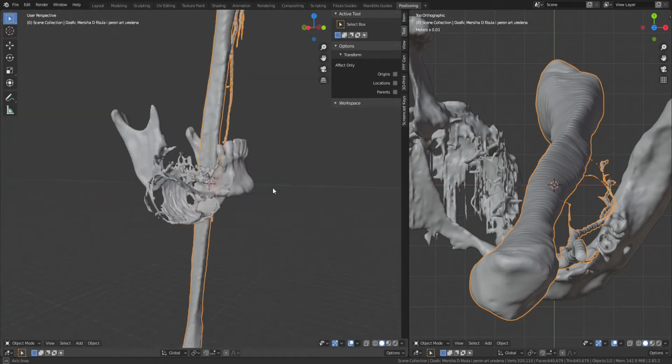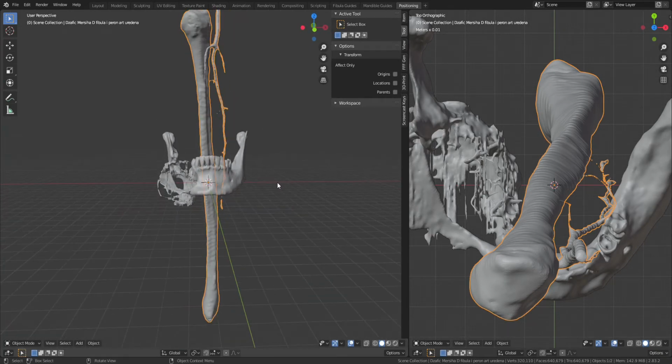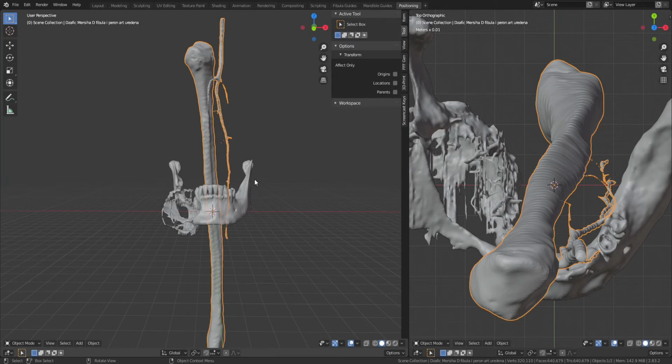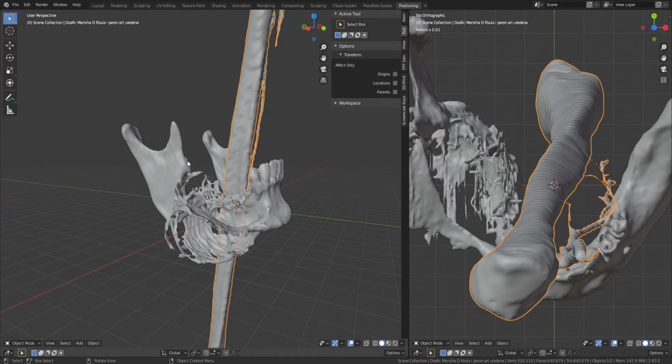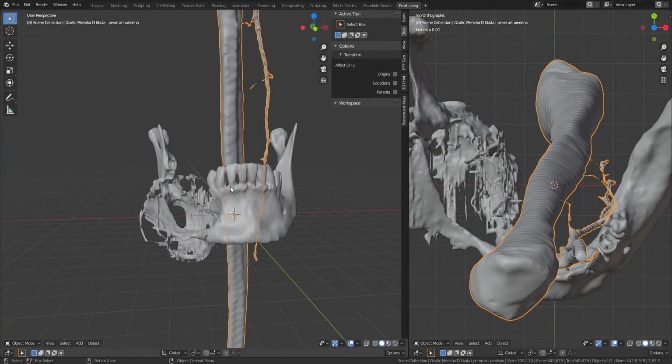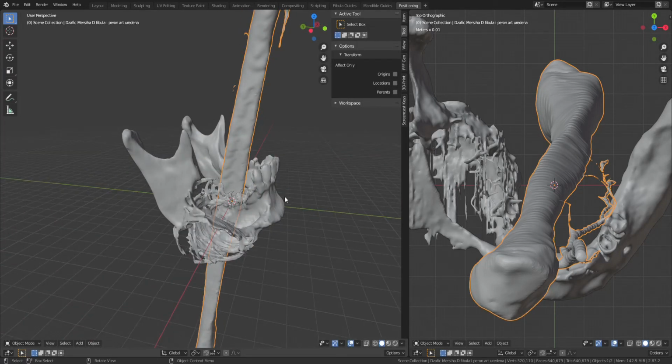Before I start, let me tell you that this time we will use the right fibula as we used to, but since the tumor is so big and the cutting planes will go somewhere here, the proximal part and the distal part will go between the first and the second tooth on the right.